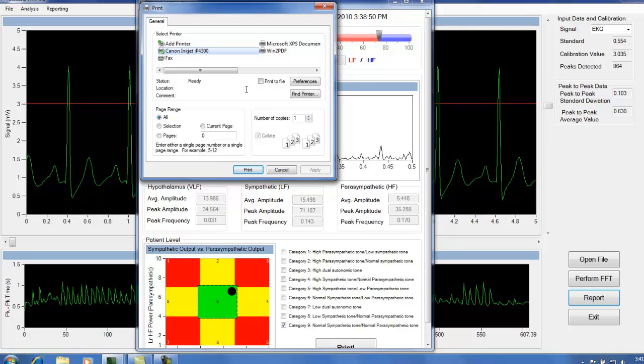If I want to save this as a PDF, we've included a Win2PDF function that you have to install separately, that we walk you through, and that's free software that will actually "print", and I say that in quotations, the document to a PDF format. In other words, it's going to take it from the screen and convert it into a PDF.